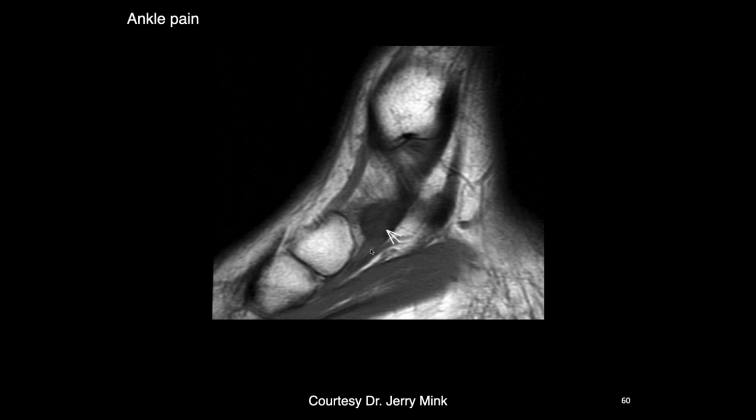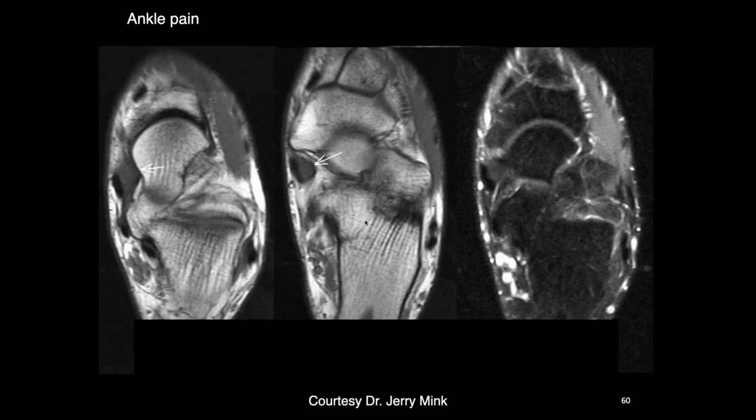Okay, so there's this low intensity soft tissue appearing structure right there, I think in the region of the posterior tibialis tendon. So this is the PTT. So I'm wondering if it's actually part of the tendon. It just looks like it's really thickened right before it attaches to the navicular. So at least tendinosis of it. I don't see any fluid signal.